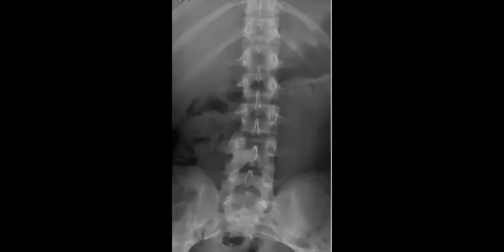So this is a lumbar spine AP view, and there is a finding in the right side. So what is your differential diagnosis according to this finding?